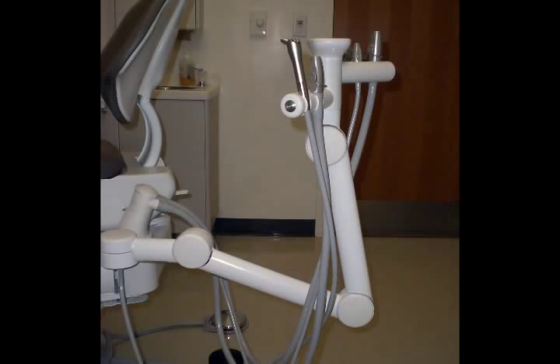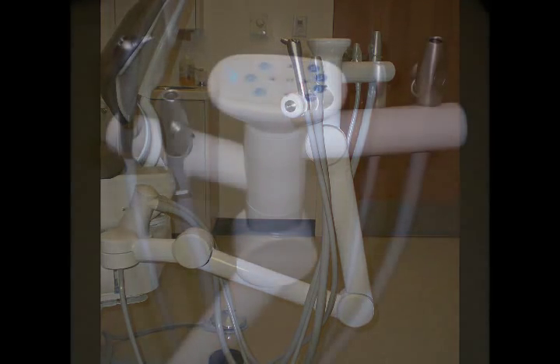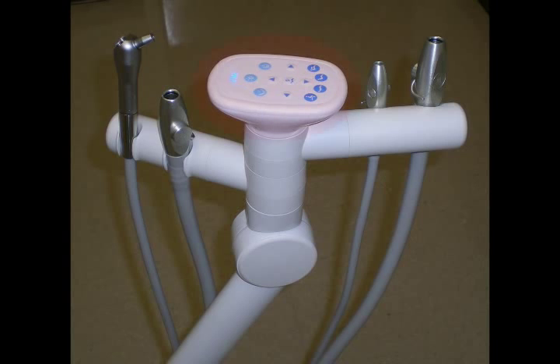We'll now move to the left side of the dental chair and take a look at something called the assistance arm. The assistance arm has several joints that will allow it to be placed into different positions. A closer look at the assistance arm shows that it also has a keypad. The keypad will function in the same manner as it does on the delivery system. In this picture, to the left of the keypad, you can see an air-water syringe and a saliva ejector. To the right of the keypad, there is a high evacuation suction and a saliva ejector.